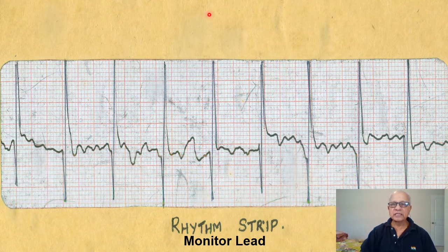Now this is the ECG taken from a female. She was 33 years old and came to the hospital with palpitations, and she has been on treatment for heart failure. That is known. Now the cause of heart failure I will ask you later. You will have to answer that. Her symptoms are of many months duration, and she was on treatment for heart failure, which I have already said.